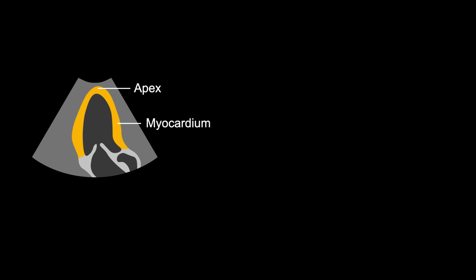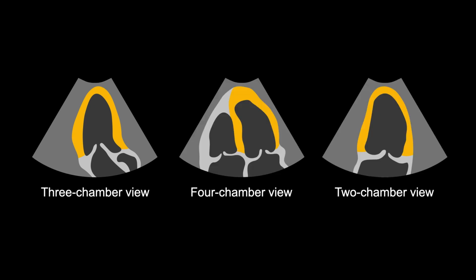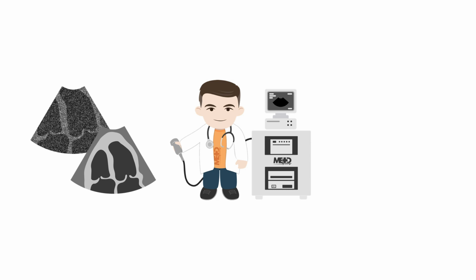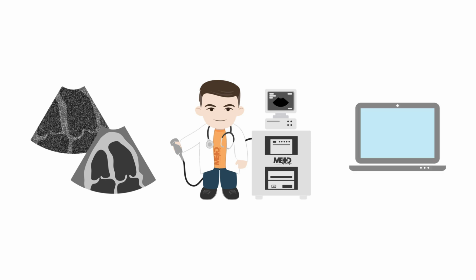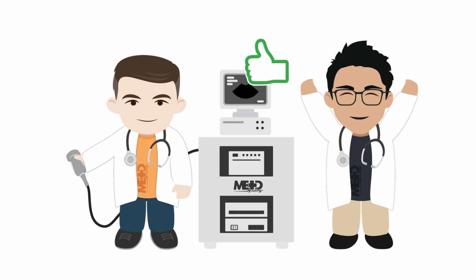These include the apical 3-chamber, 4-chamber, and 2-chamber views. Using multiple chamber views allows us to get as close as possible to a 3D picture of myocardial strain. Differences in image quality, acquisition, and post-processing can lead to measurement variability. This is why you must practice and gain enough experience to be able to verify image quality before selecting images for tracking, which will be covered in later chapters.